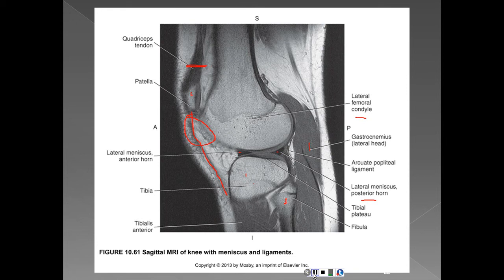And also wanted to talk about the menisci. Located between the femoral condyles and tibial plateaus are the paired menisci. These C-shaped menisci, composed of fibrous connective tissue, cushion the articulation between the femoral condyles and the tibial plateaus, and are commonly divided into anterior and posterior horns. The medial meniscus is crescent shaped, with the posterior horn being wider than the anterior horn. The lateral meniscus almost forms a closed ring, with anterior and posterior horns of approximately the same width.